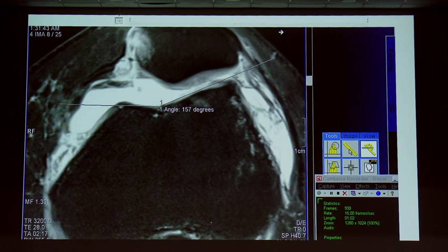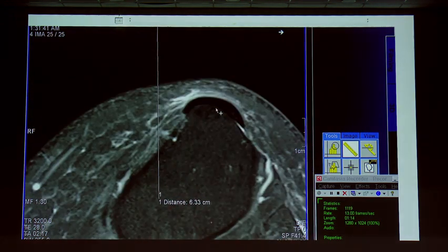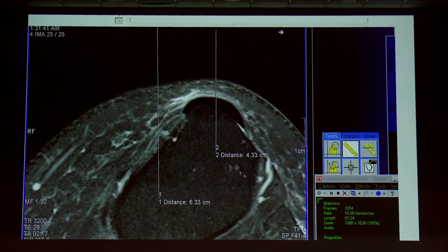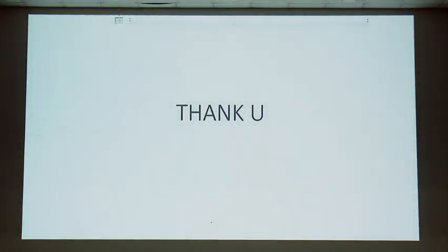And next I am putting the select series. You can see I selected the series, and this is where the trochlear groove is. So this is the TTTG distance, TG. This I am calculating, TG. And I am going down, and I am putting where the TT, tibial tubercle, is. So I am putting that central line, and you can see now we are able to calculate it. It is the TTTG distance. And how we can do it, you can see here. It is the TTTG distance. Simplified, you can see the measurements, they will come. It is a simplified rule, doing all these things confidently in a single workstation. This is one. So the first lecture is done.